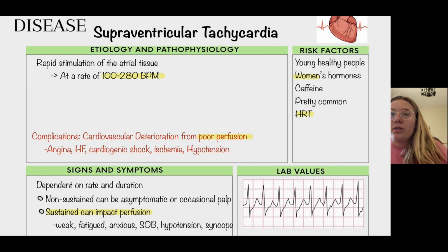Okay, so let's begin with supraventricular tachycardia. This is different from our sinus tachycardia because now I can get up to 280 beats per minute.